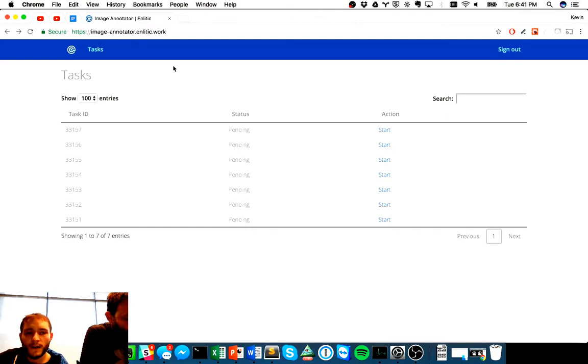But once you've logged in, you'll see a screen like this. This is your work list. Presumably you're used to seeing something like this. And this will list all the tasks that we've set for you to go through. Here you can see that I've got 7.